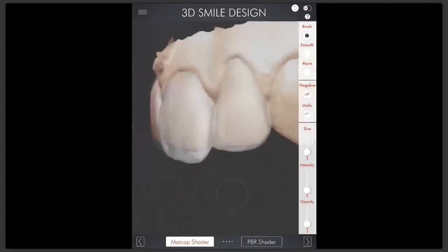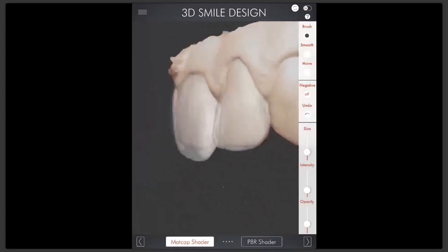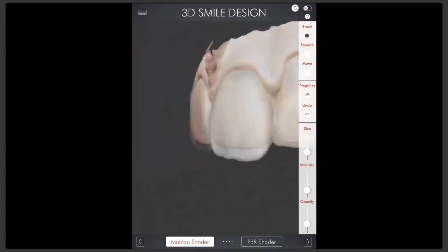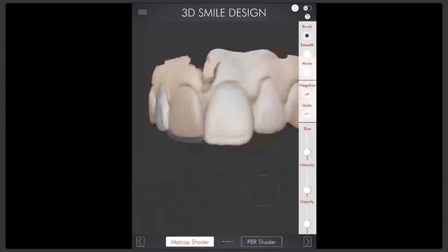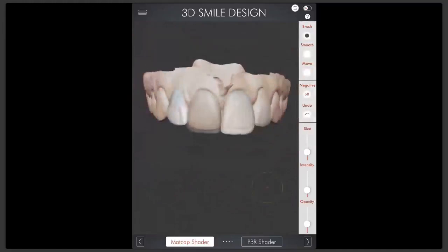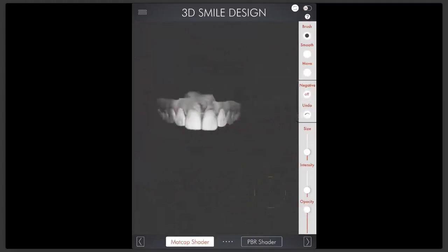So here, see, you can see the thickness that you have for your design. If you need to bring a little bit more out, you can analyze how much you are lengthening and all of that. Just move the opacity on. Okay, and we are good to go. Okay, so my design is ready. So I'm going to move forward.